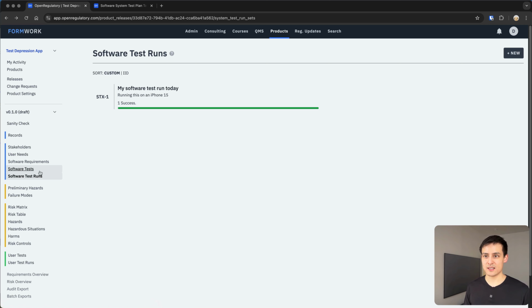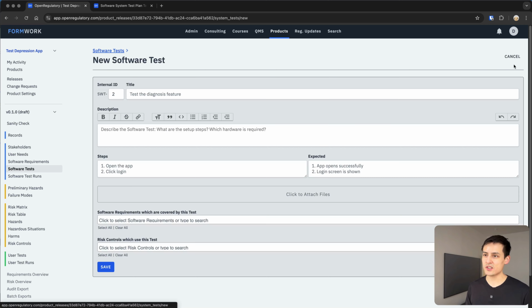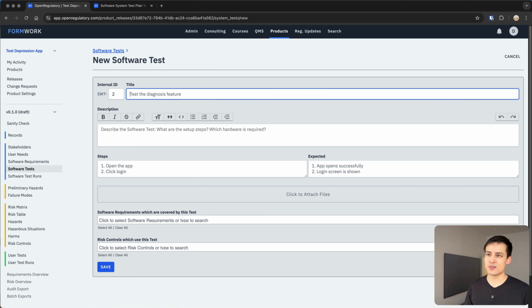We need the information which we just looked at here in the software tests. For each test, let's say you would be defining your test in your code, you would be writing your test, right? Well, you could probably get away without a title and without a description, but you would still need some sort of human summary of what this test is actually doing. So you would need this in your code, right?